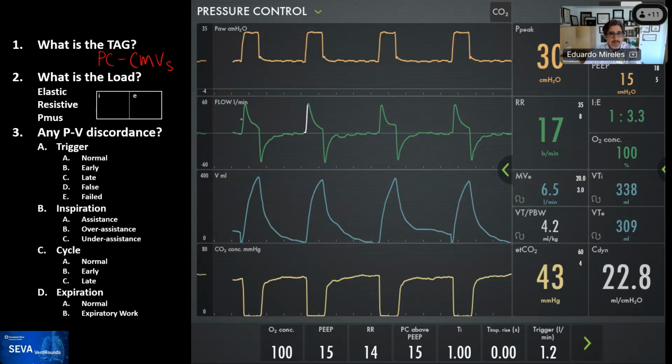And our teams are rapidly recognizing that this looks highly like elastic. If you look at the return to baseline, it's relatively fast, both in inspiration and expiration. Although each one of these dials is 1 second, you can see that it essentially returns back to baseline in around 1.5 seconds. So I think that I would agree that this is elastic. Rob? Yep, elastic or approaching normal.